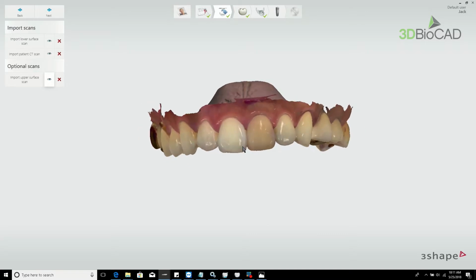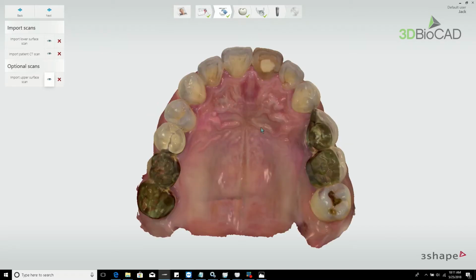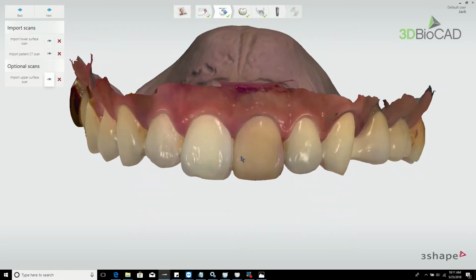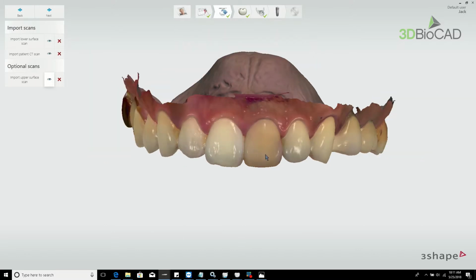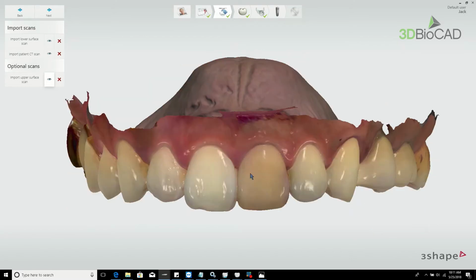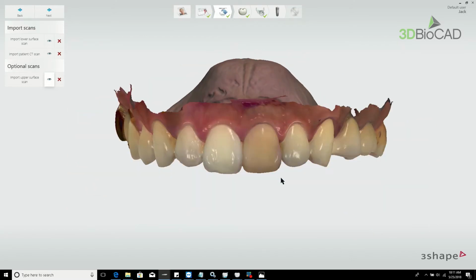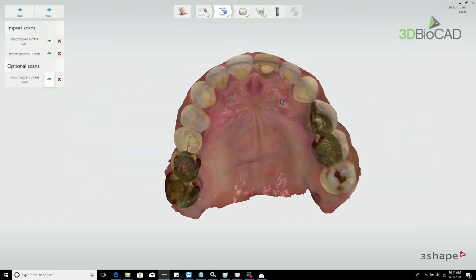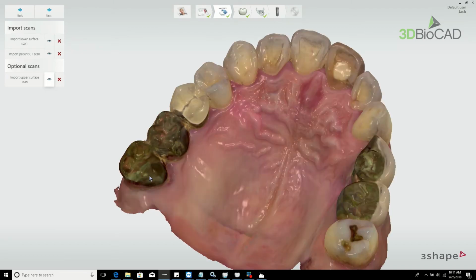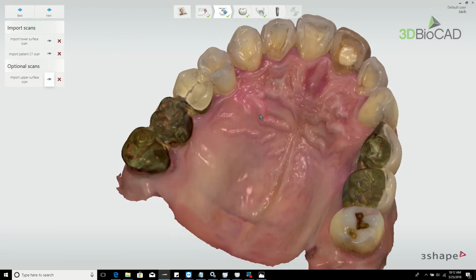And then we can see this patient's condition is so bad. This is me. We can see my tooth number 9, in Asia tooth number maybe 21, has a bad color. We can see the color difference. It was scanned with the Trios, which means Trios captures color super well. And if you look here, there is an old gold porcelain bridge, left and right.